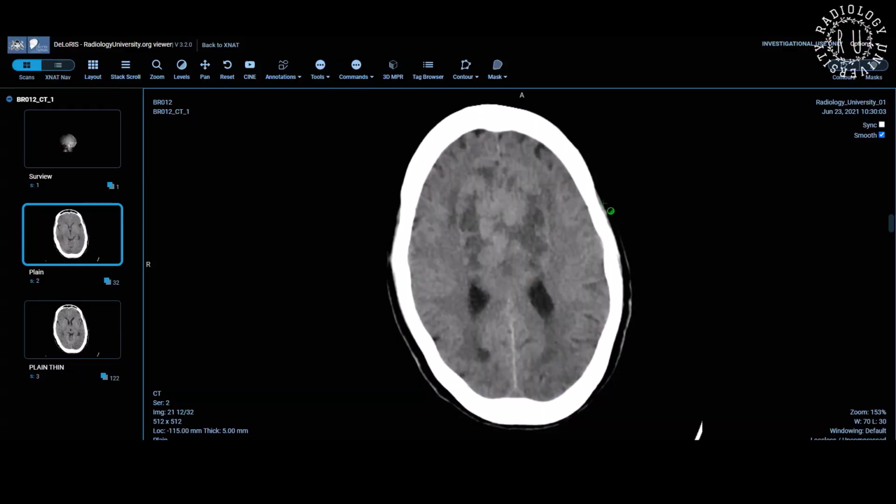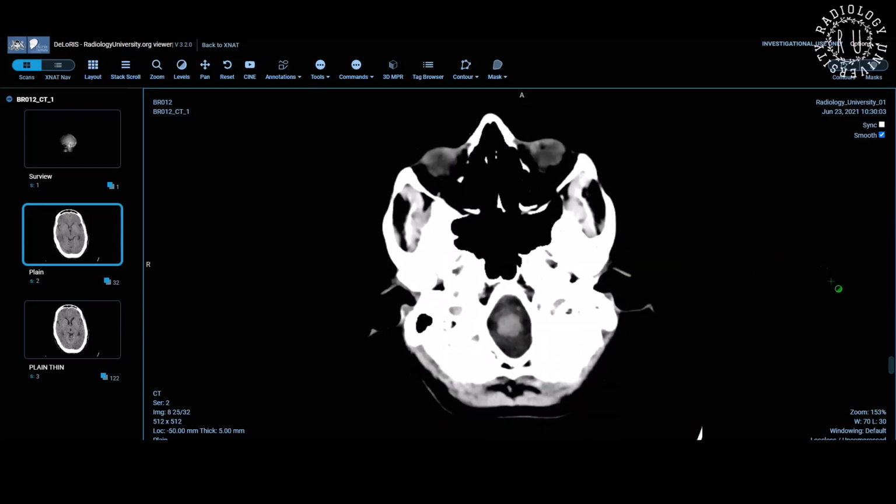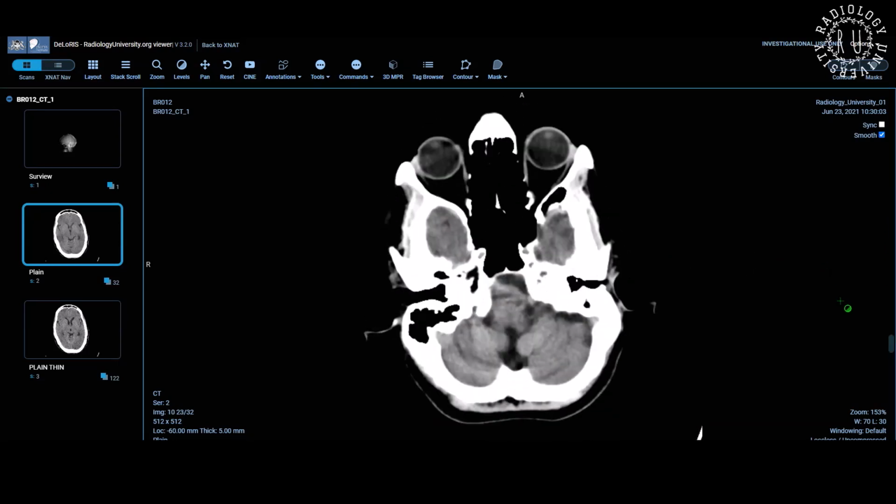Yeah. Sure. Thank you. So, patient presenting with headache. Yeah. Okay. I'm scrolling from below to up.